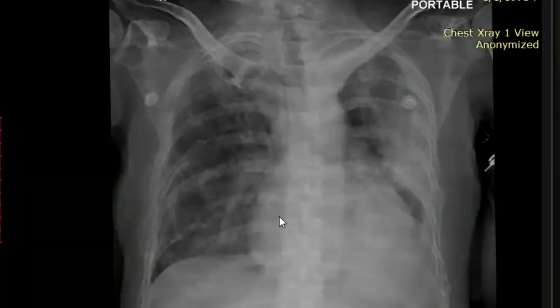I'm provided with an X-ray chest frontal projection of a skeletally mature patient, in which I can appreciate a well-defined lobulated homogeneous opacity in the left hemithorax, which has reduced volume. This opacity is forming an obtuse angle with the lateral chest wall, so it is most likely pleural based.